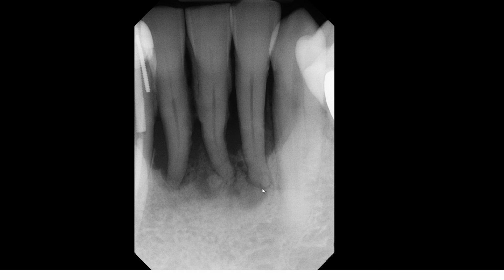Okay, so that's it. I just want you to see again how PCOD can appear slightly differently based on either panoramic versus periapical radiograph, and being able to detect these on a panoramic radiograph would be a great skill to have.